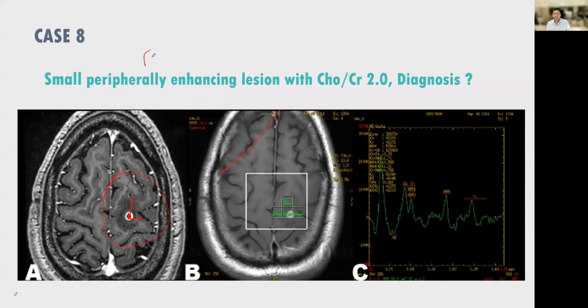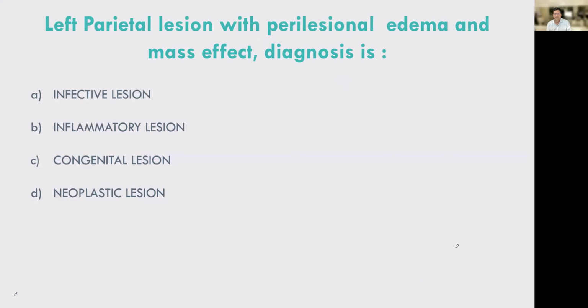Don't be a cowboy radiologist who jumps in and says, I'll diagnose everything. Somebody is already asking: can we differentiate tuberculosis based on MRS? It is said in textbooks that lactate is a predominant component in neurocysticercosis. But see this case, it is a failure where you are seeing lipid lactate, and I have performed 135 to 145. Ideally, if this was a lactate peak, I should have seen a doublet here, which is not very classical here. The doublet is not really seen very well.